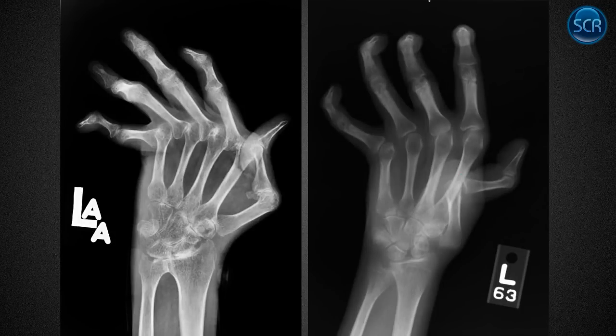Here's a case where you see some extensive alignment abnormalities that you would usually associate with RA. We've got a hitchhiker's thumb here, ulnar drift, a swan neck deformity. These are two different people, by the way. Dislocation of the base of their CMC joint here. And so this is lupus. If you see all the changes of RA, but you don't have any erosions, so something that looks like RA sans erosions, that's typically lupus. It's a non-erosive deforming arthropathy. That's the thing you want to memorize.